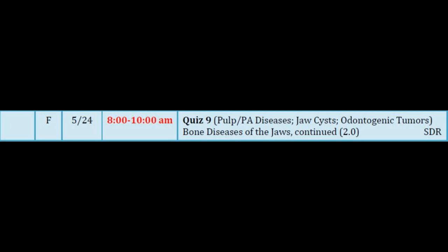And it is a pure lucency. In the skeleton, classic lesions are a soap bubble multilocular lucency, but we don't often see that pattern in the jaws. These are the only two I have in my files of a soap bubble multilocular lucency for a central giant cell granuloma in the jaws. Most of the time they're unilocular, but they are always pure lucencies, and the most distinctive feature I've come up with that helps me have a suspicion for central giant cell granuloma or central giant cell tumor, if you wish to call it that, is the fact that there's no bone reaction. It has a punched out border. It goes directly from pure lucency to normal bone on the outside without a cortex. What is this?